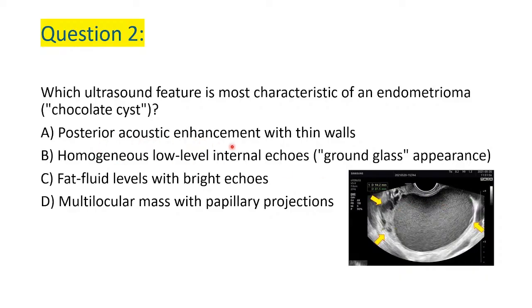A. Posterior acoustic enhancement with thin walls. B. Homogeneous low-level internal echoes, ground glass appearance. C. Fat fluid levels with bright echoes. D. Multilocular mass with papillary projections.